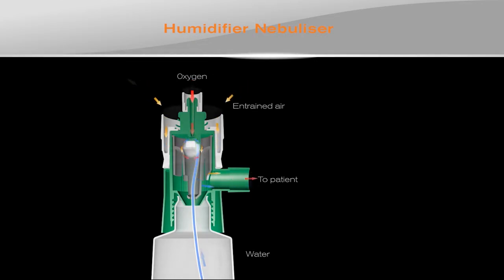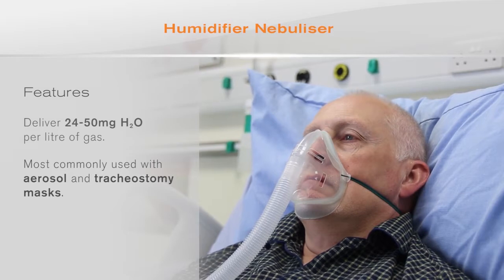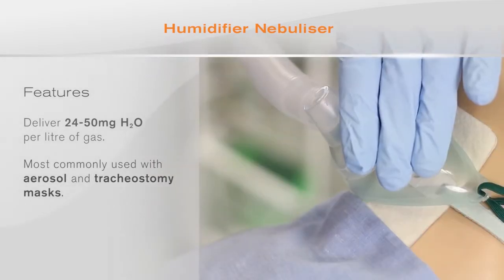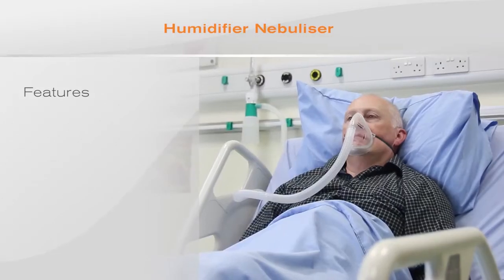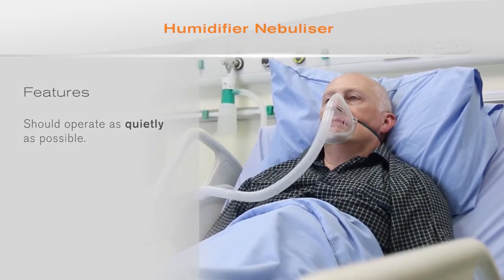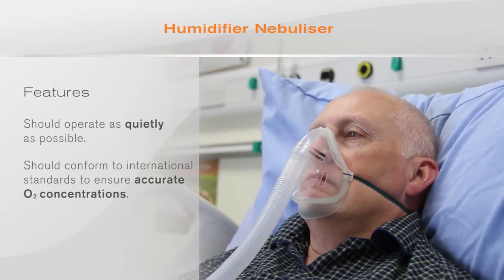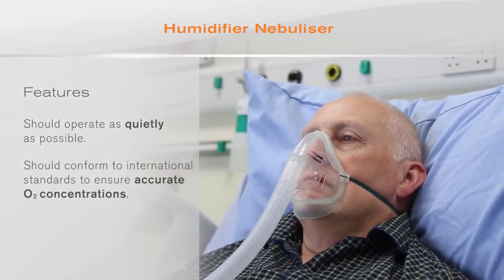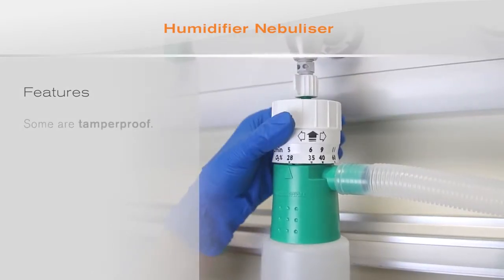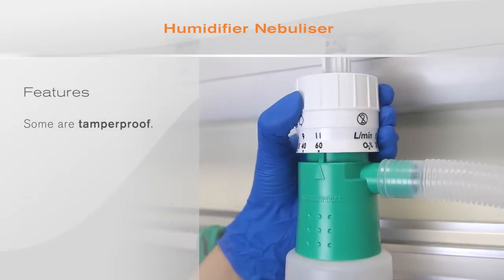Humidifier nebulizers can deliver between 24 and 50 milligrams of water per litre of gas, depending on the flow setting. They are most commonly used with devices such as aerosol and tracheostomy masks. It is important that these devices operate as quietly as possible to ensure a comfortable environment for the patient. They should also conform to the international standards to ensure that the oxygen concentrations are delivered accurately. Some devices, for example the Aquamist, are fitted with a tamper-proof control to prevent inadvertent changes to oxygen concentrations.